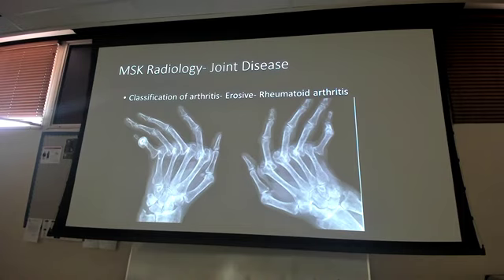So we have metacarpal, proximal phalanx, distal phalanx, and that's the middle phalanx. That's basically vertical because of the swollen joints. This is very painful.